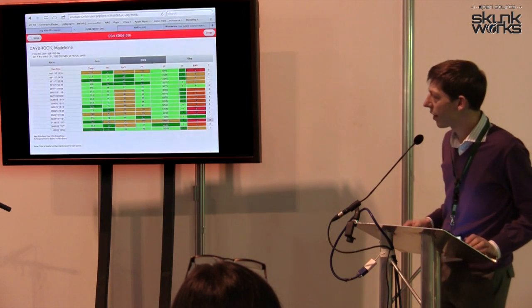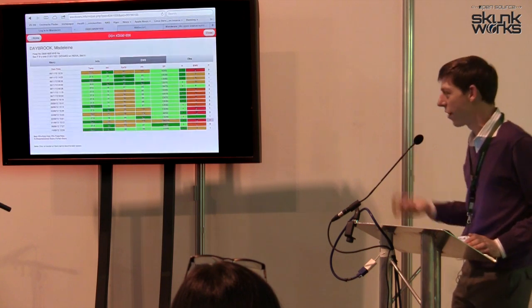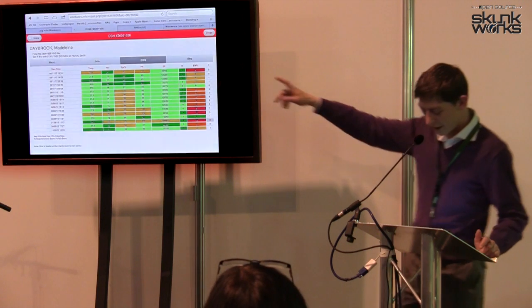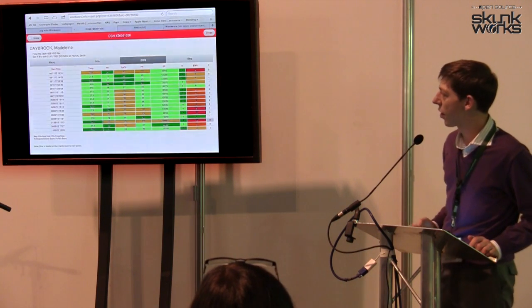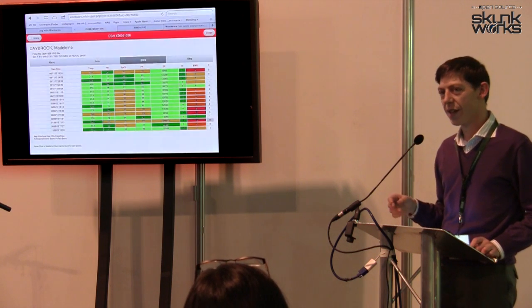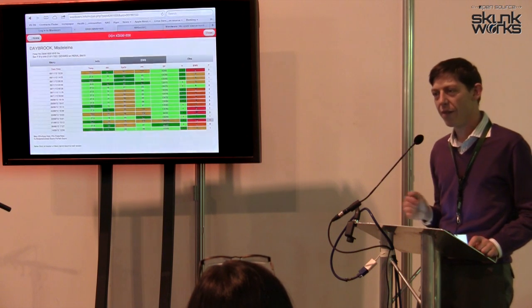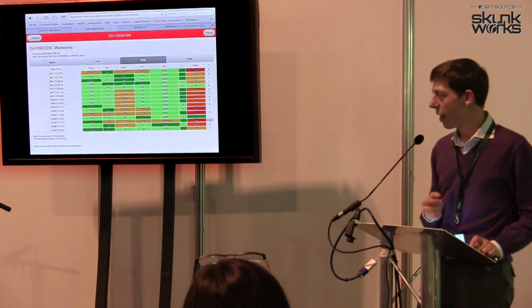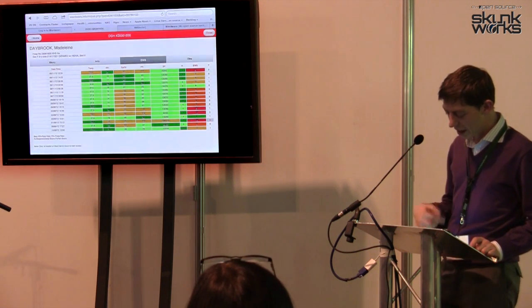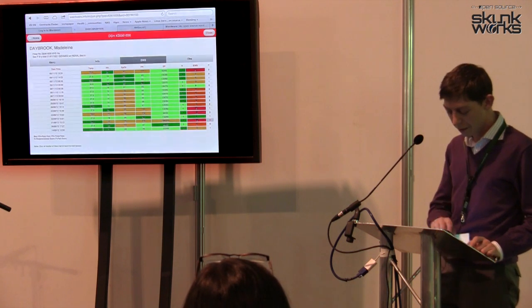We can see that here, tabulated data, quite easily color-coded. When you've got it in your hand, of course, it's a bit easier, it's right up close. If anyone needs to put their glasses on, they can do that. But as you can see along the screen there, we've got the EWS 8 at the top. We're following the colour scheme that the Royal College of Nursing and the Royal College of Physicians have been advocating in their campaign recently about doing the EWS much more systematically in the trusts. And the algorithm behind it is actually at the moment using the National Early Warning Score algorithm.